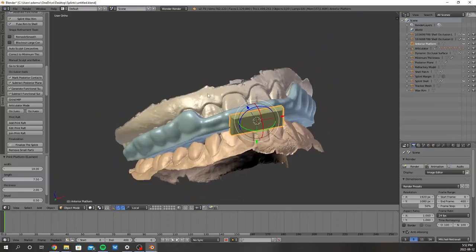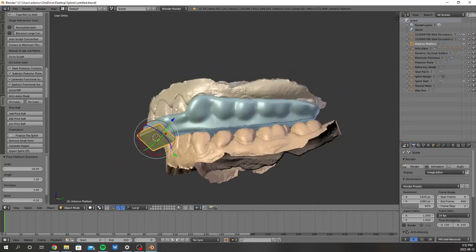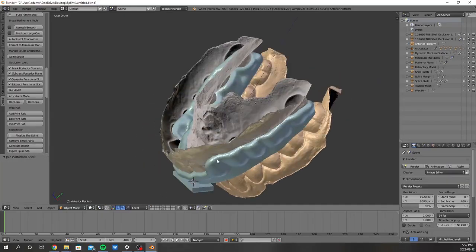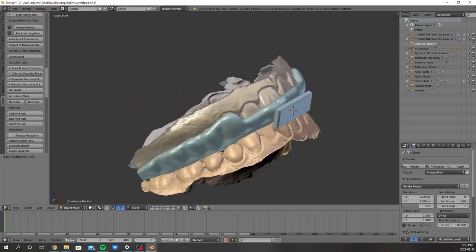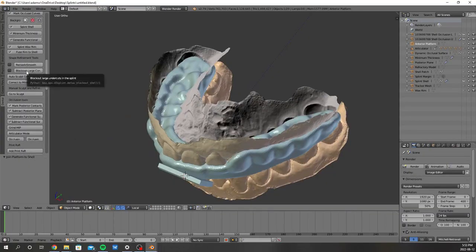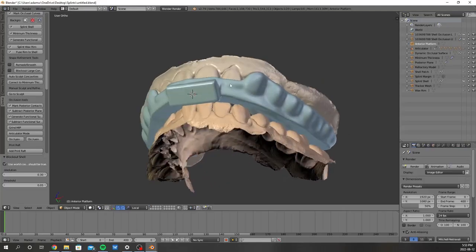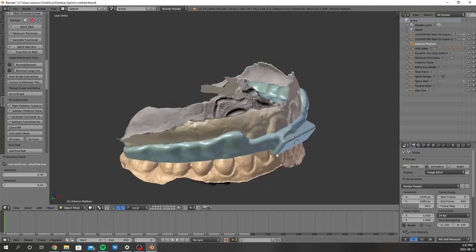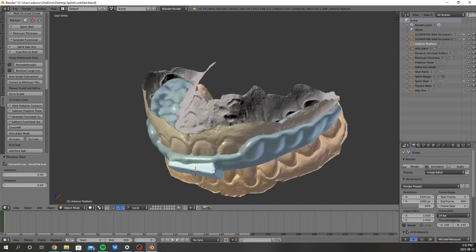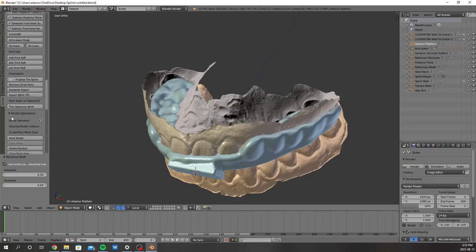I'm not too fussy about where it goes, as long as you just imagine you're gonna have to trim this off. So as long as it's not too goofy. Then I hit join print raft. Take a peek, make sure it looks okay. Sometimes I'll come in here too and I'll just do this again, and it'll actually fill that in a bit, because it would have had issues printing that. You don't have to do this. Sometimes it just kind of goofs it up, but I just saw that there was a big space here, so I did that.